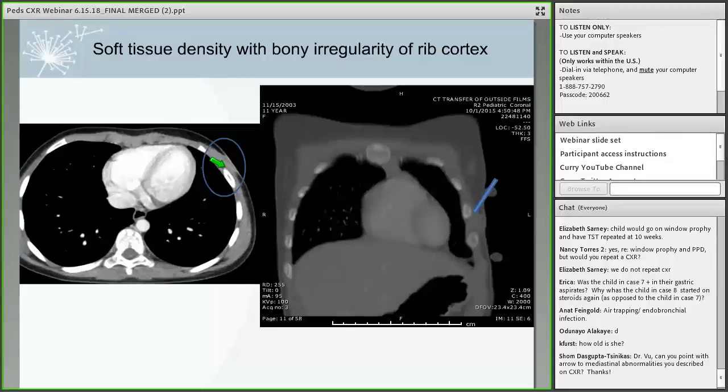I guess that would be my primary diagnosis, and then if not, if that area is really inflamed, the skin's really inflamed, then I would consider some kind of infection or inflammation associated with this rib. The rib itself looks fairly normal. I don't see evidence of fracture on the rib itself, but just an area of soft tissue abnormality adjacent to that rib. Unfortunately, this projection isn't very good, but where the blue arrow is, if you could see this image directly, you could see that the cortex of that rib is disrupted and hazy, ratty looking.